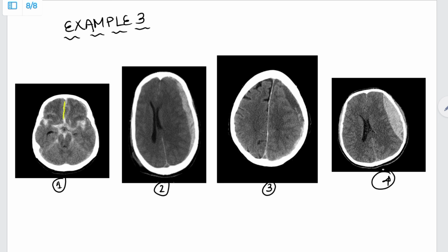Now this is another interesting example. Now by now I hope you have realized that all those four examples are that of bleed due to the presence of hyperdense lesion, but the structure of each of those lesions defines the area of the bleeds. In the first example, the bleed has spider-like legs, and therefore this is an example of subarachnoid hemorrhage. This particular pathology has occurred at the level of the circle of Willis, as you can see by now.